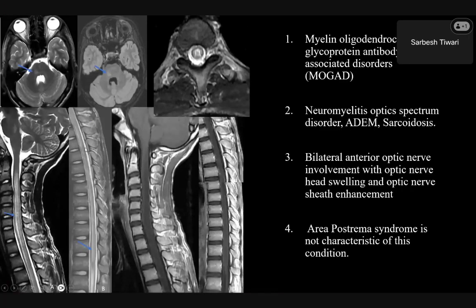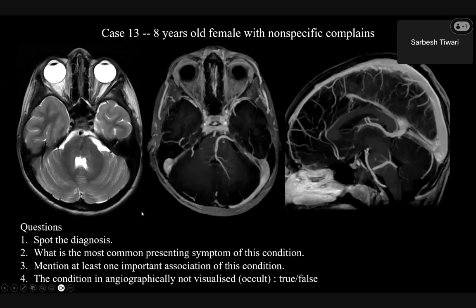Very good. And cavernomas otherwise will not be seen. So remember, cavernomas are angio-occult. However, DVAs are seen on the angiogram. So I have given you a good diagnostic cerebral angiogram where you can see the DVA. These are the medullary veins. This is the collector vein draining. This is a classical example of a DVA on an angiogram.